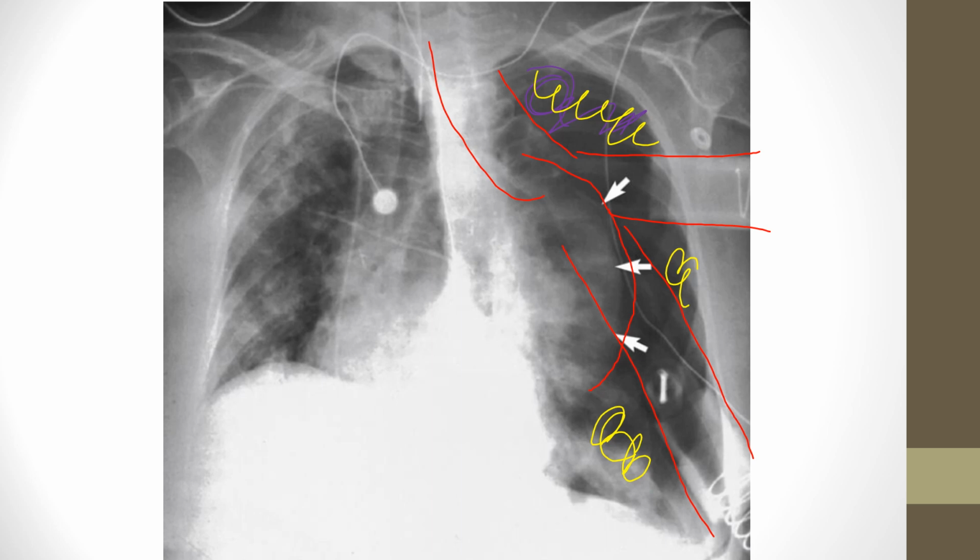But look at where the heart is. Do you notice the heart has structures have shifted over, right? It's shifted over, and so therefore we can see that mediastinal shift on this patient. Now, keep in mind, if you're looking at the clavicles, they're asymmetrical on this patient. They're not symmetrical, so that could show some rotation as well. But keep in mind that with this pneumothorax, it most likely is causing some pressure on the heart. So a chest tube should be probably inserted pretty urgently, if not emergently, into this patient's chest wall, especially if they're on positive pressure ventilation.